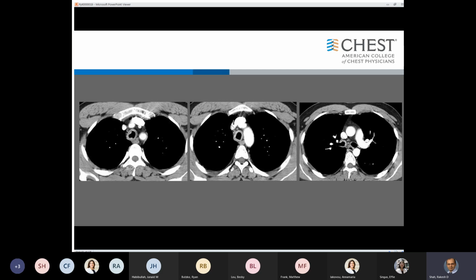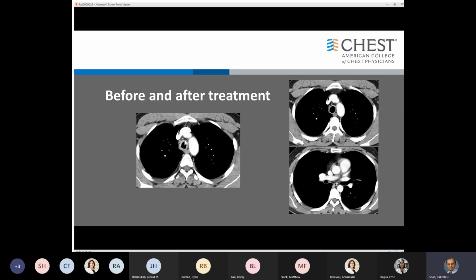This is an interesting patient. He was 25 years old and came to North Shore. He had a history of testicular cancer, and so we thought about metastatic disease, but it's pretty unusual to have mets to the trachea. He underwent biopsy, and we thought that it's possible that he could have infection, so we did send the specimen for culture. It was in the differential diagnosis, and it did come back that he had rhinoscleroma. It's a rare entity, rhinoscleroma. Before and after treatment, you can see that there is narrowing.